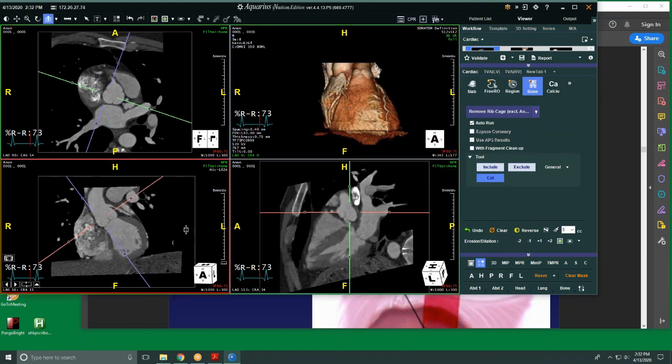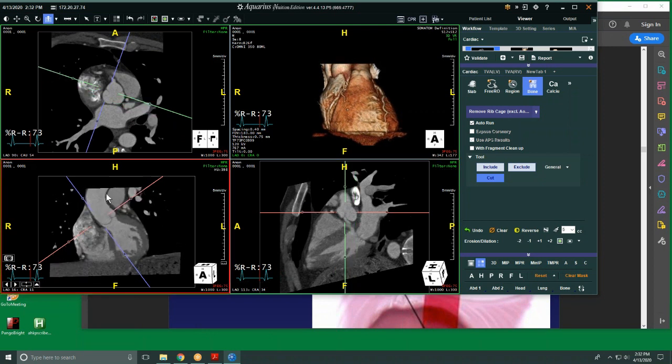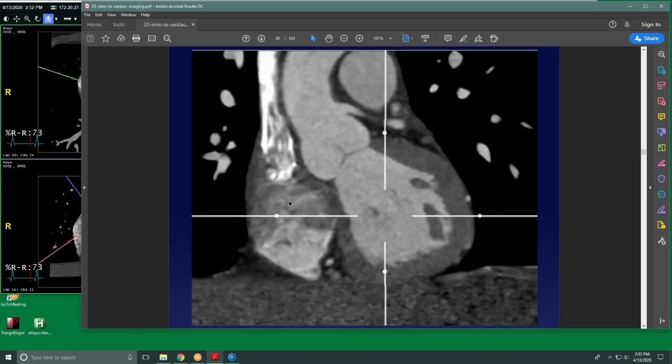Okay, now going up, that's your aortic root. That's your sinotubular junction where the sinuses of Valsalva transition to the ascending aorta. And then you've got your ascending aorta right here. We're not going to go into the aortic arch branch vessels and stuff. That's not really cardiac imaging, but I at least wanted to talk about the aortic root.